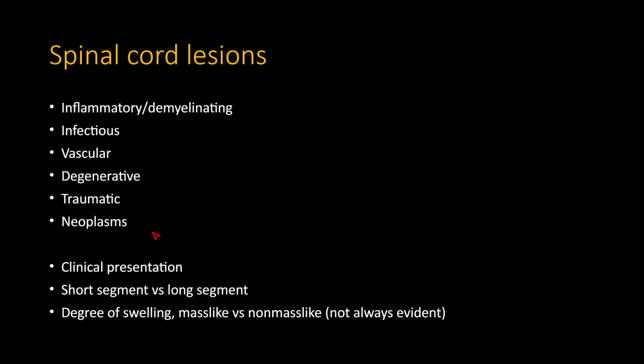lesions. Whenever you're thinking about spinal cord lesions, it's important to think about the clinical presentation. As far as imaging goes, whether short segment or long segment, the degree of swelling, and whether the swelling is mass-like or non-mass-like. And as we'll see, it's not quite always evident.